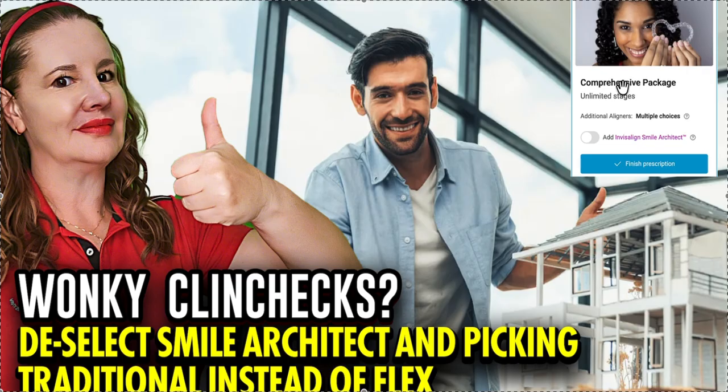Okay, now let's talk a little bit about Flex versus traditional. I've made some other content on that. Align has been pushing heavily for the transition from traditional to Flex. I believe it involves using less man hours. I don't know if it does. They're saying, the AI is saying, that it's been overwhelmingly positive. That's because they have, in my opinion, been pushing on the speed aspect, which has been nice. But when I look at these Clinchecks, I'm like, what the heck? They're so bad, the Flex ones, and they're not even realistic. So even though people think it looks really great, I know there's going to be an epidemic of cases not working out, or worse.